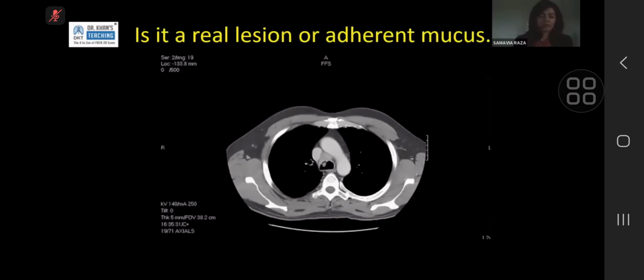You think to yourself, is this actually an endobronchial lesion, originating from the wall of the trachea or the right main bronchus or the left main bronchus? The description we sometimes use or suggest is something called dependent or non-dependent. So when you're lying down flat in a scanner, if you do have a bit of mucus, it's going to layer along the dependent portion. So if the same lesion that I'm showing you here was along the posterior margins, somebody would be rightful in dismissing that and calling that mucus. Because this is hanging from the top, you're slightly more concerned that this is not mucus.